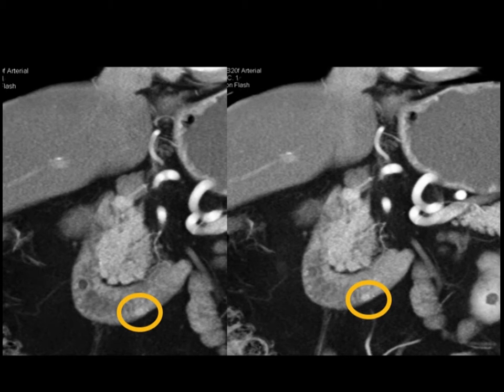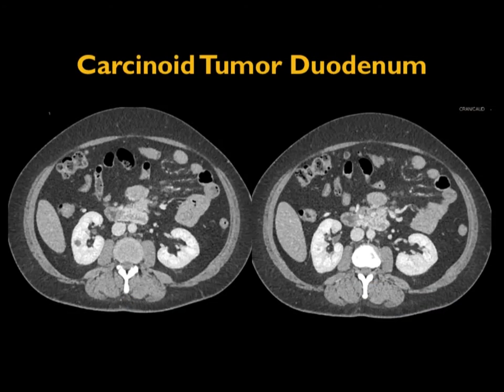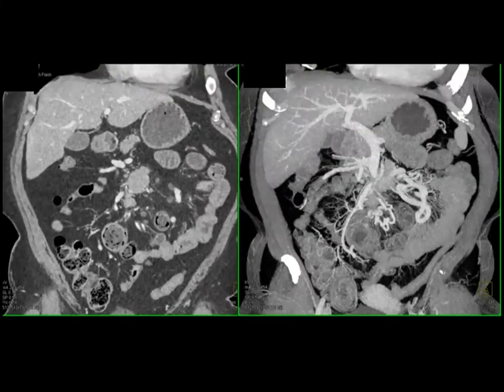And that's the kind of lesion you are going to pick up if you're very careful. Another example, abdominal pain. What you see here is thickening and enhancement of the fourth portion of the duodenum into jejunum. Then you see a large mass in the mesentery that looks like multiple nodes between the mass and the small bowel. Maybe they're all nodes, but here it is on the coronal view.